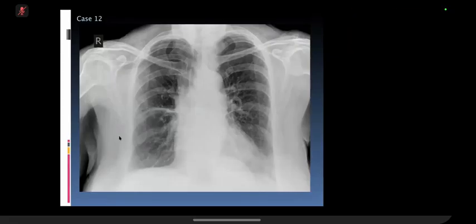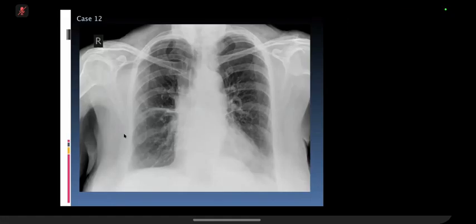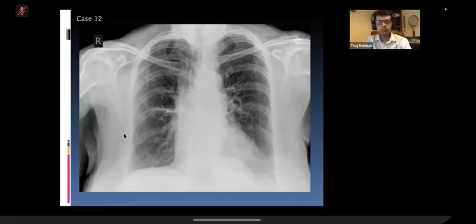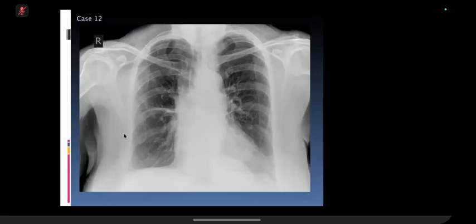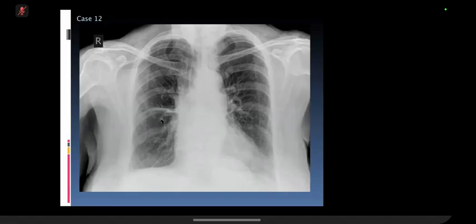Okay, this is a frontal chest radiograph again of an adult patient. The trachea is relatively central. Looking at the mediastinum, I don't see any obvious pneumomediastinum. Yeah, there's no pneumomediastinum in this X-ray. The lungs are, yeah, ignore the lungs. Looking at the bones, bones are fine.